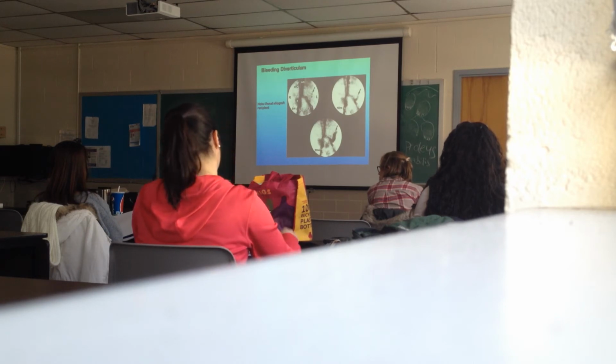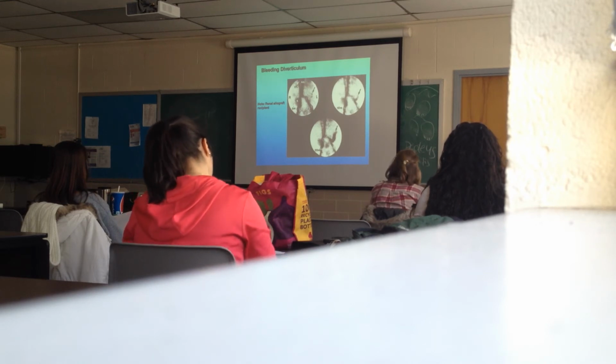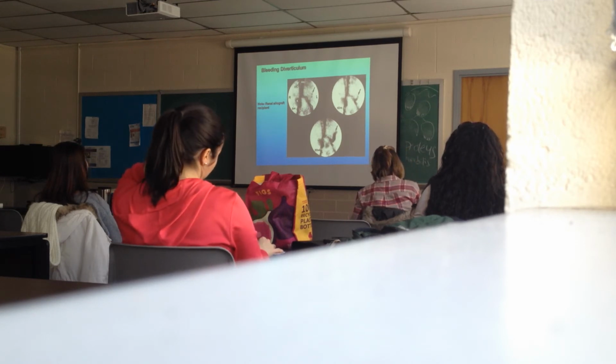Okay, so the scintillation scan is on. You've seen a few of them. This is a scintillation scan showing you perfusion. You can do this a number of ways.